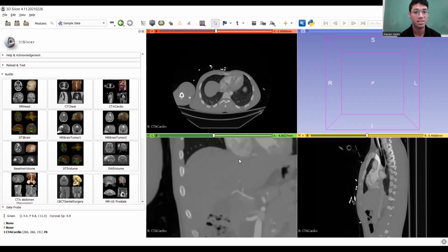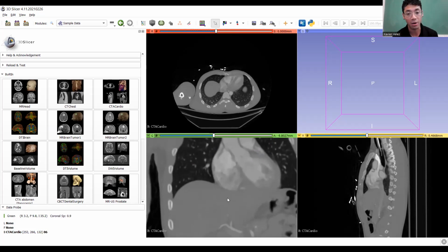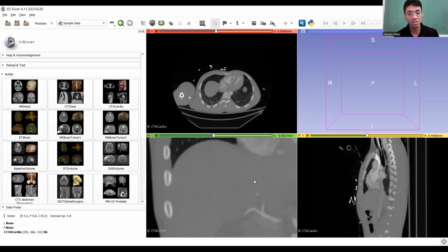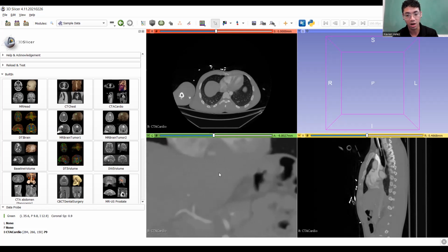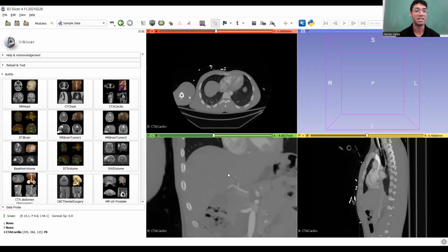And one of the fun ways that Slicer works, especially for one of the bigger steps, which is the grow from seeds step, which is primarily going to do most of the heavy lifting for us, is that it works by taking the differences in color and using those to segment stuff out. So if Slicer doesn't see a whole lot of difference in color, like here, it's not really going to know what is and isn't liver.